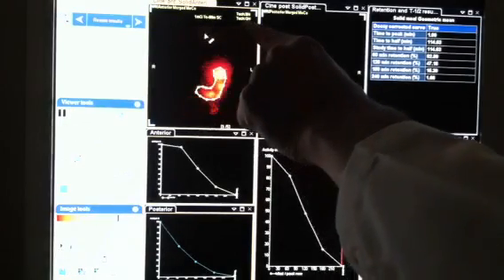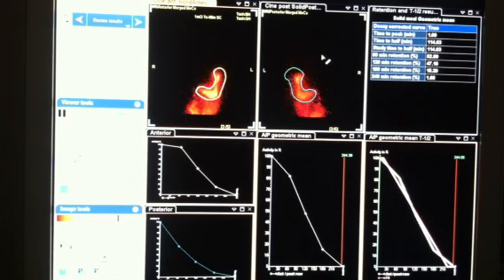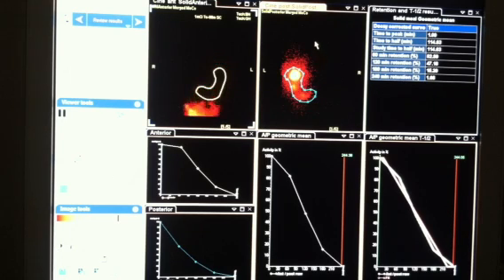Bring up the dose. Now I already have mine populated with my initials here, and it's already labeled anterior and right and left. This one's left and right. So what I like to do is first turn this one off. Hit Control, and then right click on it, and that's going to bring it off. It's going to turn off the cine.